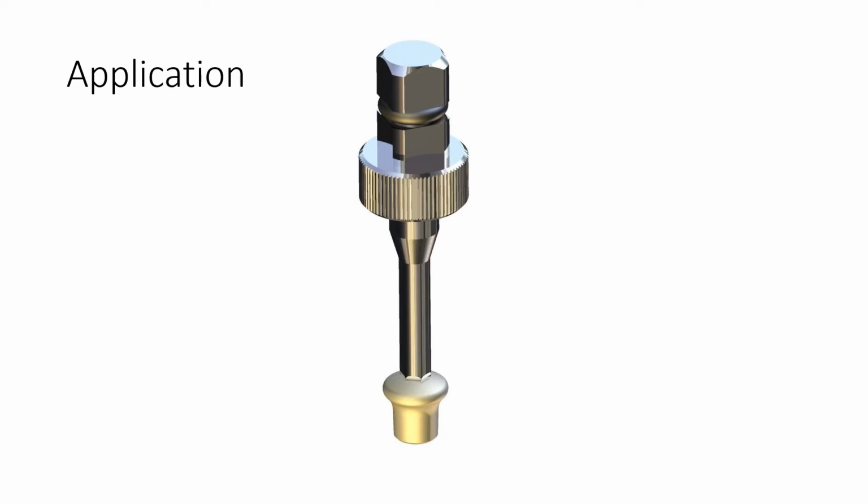So the one instrument, the universal hex tool, has three functions. It positions tissue expanders, which are a range of our healing abutments. It is used to position our cover screws, and it is also used to insert all our prosthetic components and post screws. So this is a very versatile instrument. It cuts down on the amount of inventory that you will need to carry. It's easier for your nurses to maintain and store. So it's a very useful tool, and it's a very complex tool to manufacture.